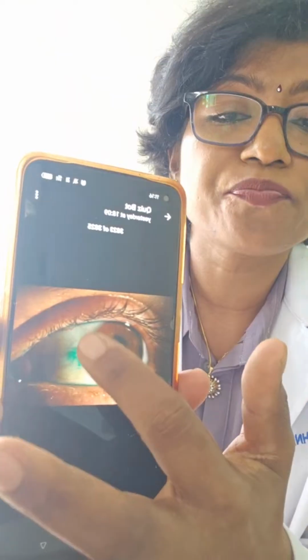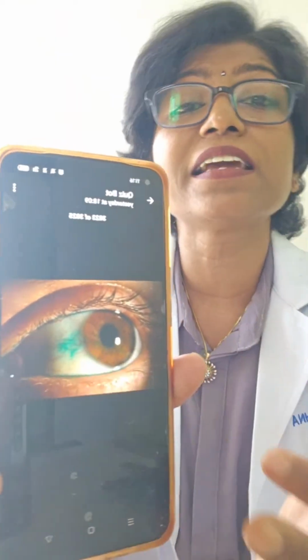So this is a conjunctiva which is stained green. So this is not Stocker's line. Episcleritis would be red in color. No. Intercalary staphyloma? Do I see anything bulging at the limbus? No. It's a conjunctiva which is stained green. So what is this? This is lissamine green staining the dry eye.